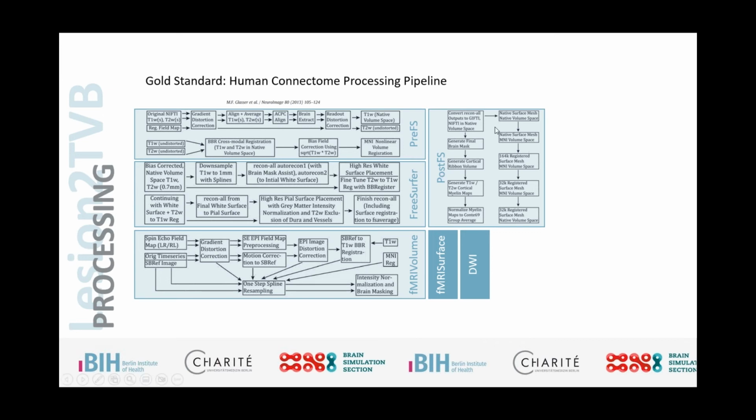And then at the end, we have the PostFreeSurfer step, which cleans up a lot of the interim results from the FreeSurfer and also maps a lot of this to the HCP-specific grayordinate space, which we're not going to get into today, but at the end, it's also trying to incorporate the information that we had extracted during the FreeSurfer to our initial PreFreeSurfer data. So we end up with our final extracted surface, with our final processed T1 image, etc.